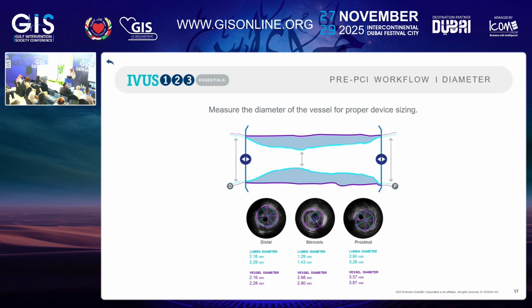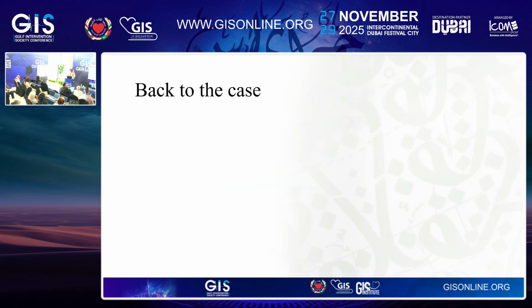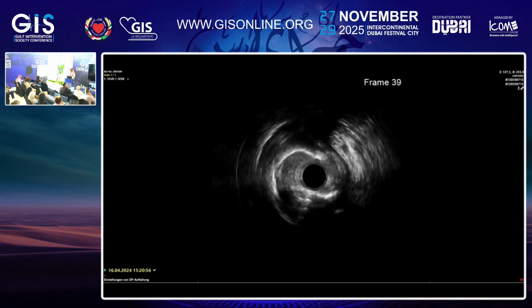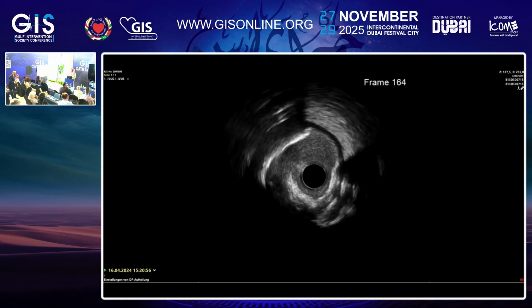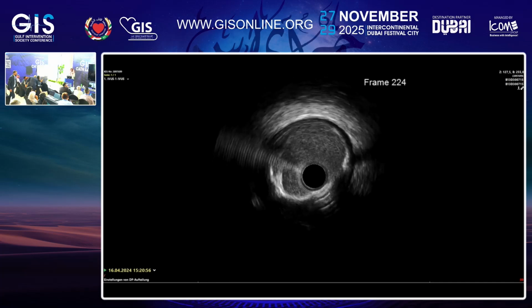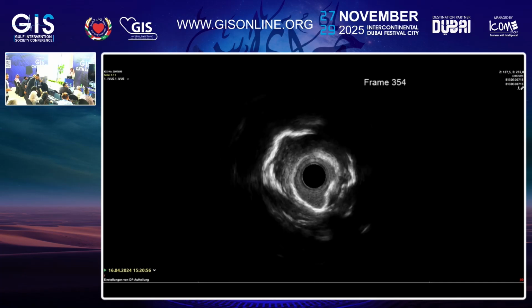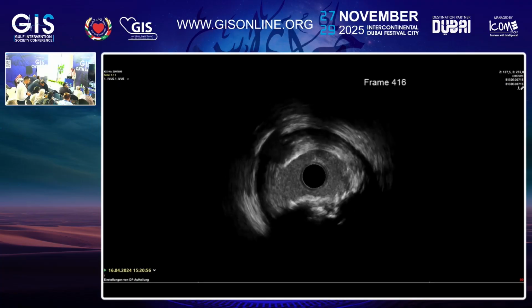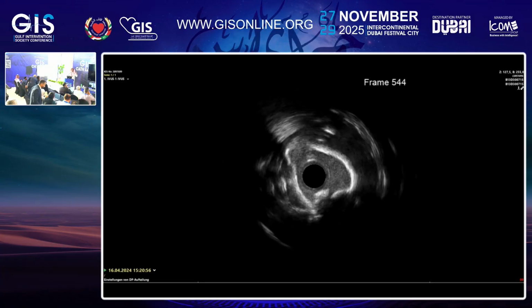So, just because I want to dig into the workflow itself, as we're going to cover those. So this is the run. I want the help of my colleague. Do you have the workflow? Do you have the first run? This is our first run before we did the PCI. So we said, what do we want from this run? Distance.